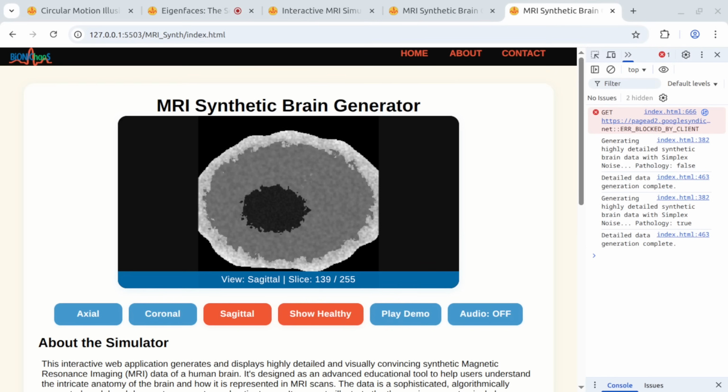Okay, that actually sounds good. Can we add that and make it lower by default? Can we have three different options, very low, medium, and very high, and just select the medium value by default? Can you just modify the code, then let me know in conversational style what changes were made?